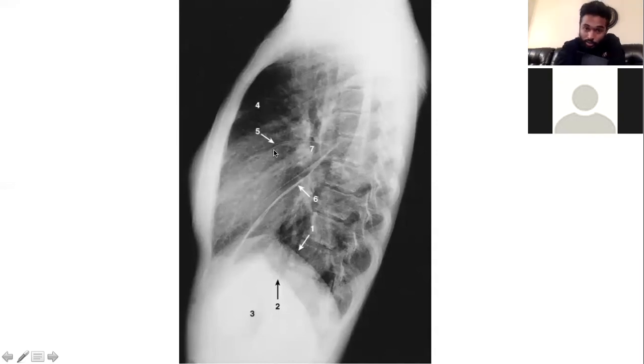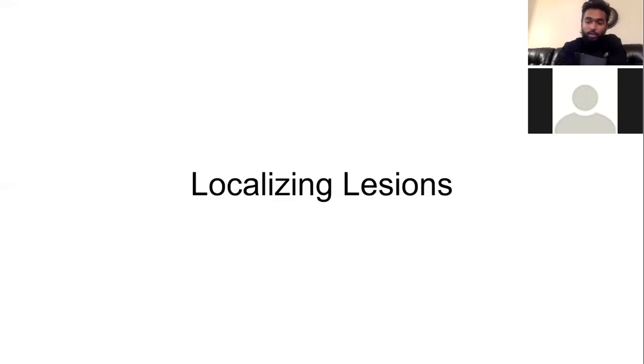You see this little line right there? That's your horizontal fissure. T5 to the anterior one third, that's your oblique fissure. Once you have those, wherever the lesion is, you can just tell where it is. And remember, the left lung is not going to have a horizontal fissure, so that makes it even easier. That's all you need to localize where a specific lesion is.